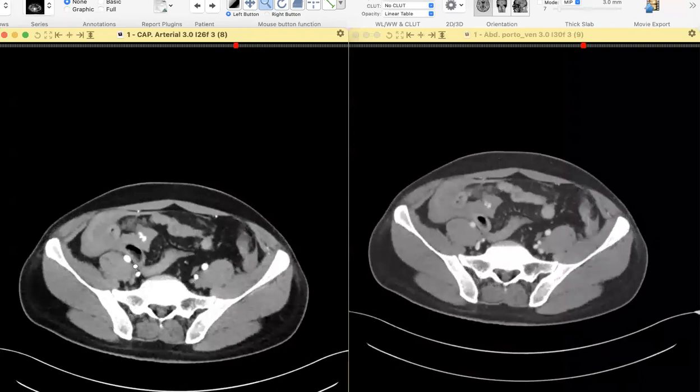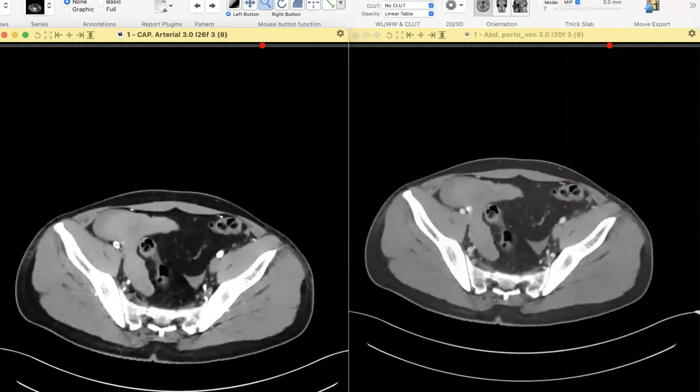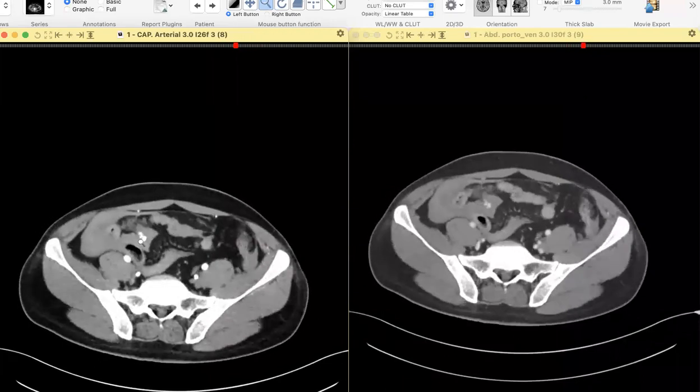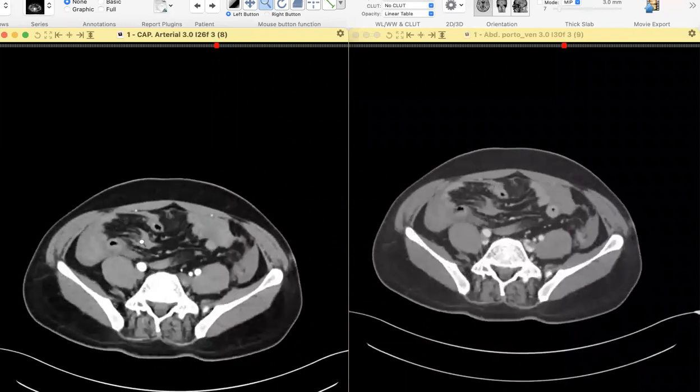Right? No, this is the internal. Oh, sorry. This is the internal iliac artery. My bad. So this is the external iliac artery, and this is completely in the mesentery. So this signifies a mesenteric tear. So that is the emergency.